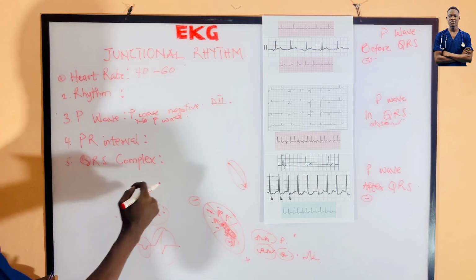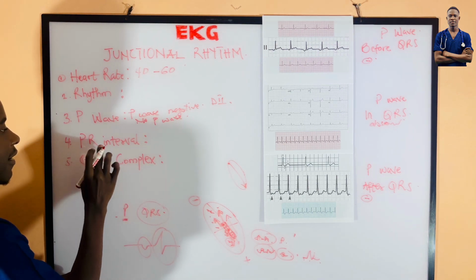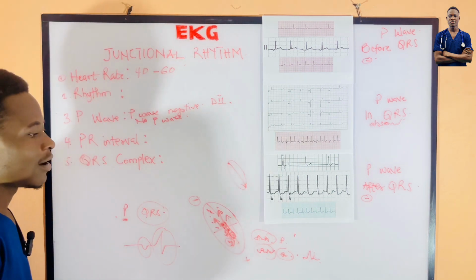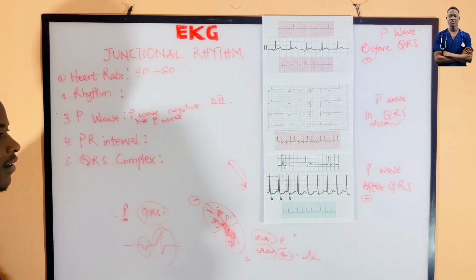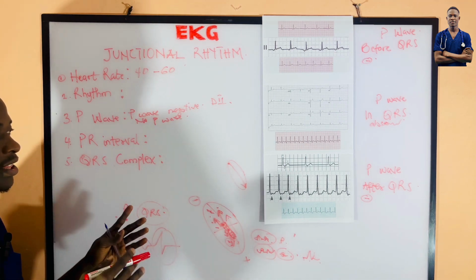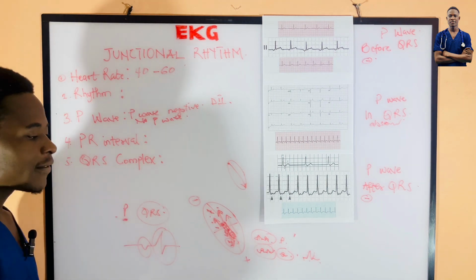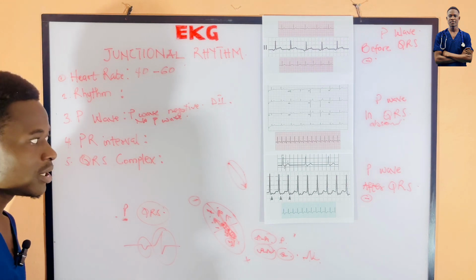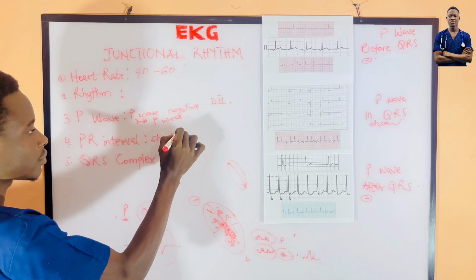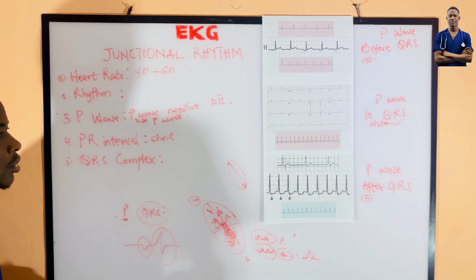Now, let's look at the interval. Let's look at the PR interval. How are we going to identify the PR interval? The PR interval can be short.